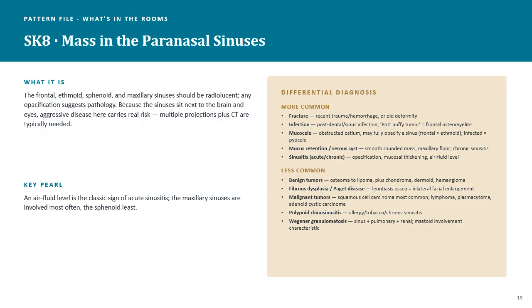something called sinusitis. And with that, on the X-ray, we're looking for an air fluid level where we can actually see a line between the air and the fluid. That is a classic sign for the radiologist or doctor to say that the patient might have acute sinusitis. Now, trauma can also cause blood to collect in the sinus, and also things such as cysts and tumors, which are less common, they can cause the sinuses to look opaque on the radiographic image.